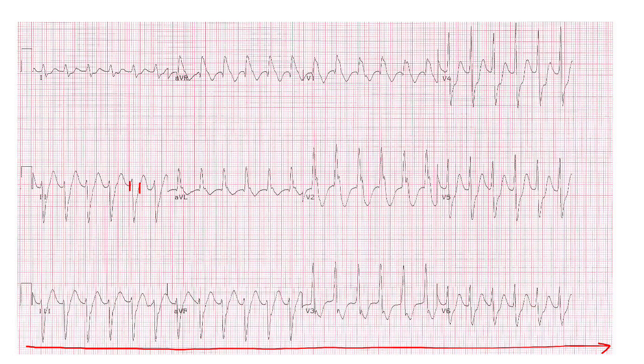And so I have a regular rhythm with a prolonged QRS complex and no discrete P waves. And if I were to measure my rate, it's probably running about 150 beats a minute. So that's greater than 140. So this is likely VTAC.